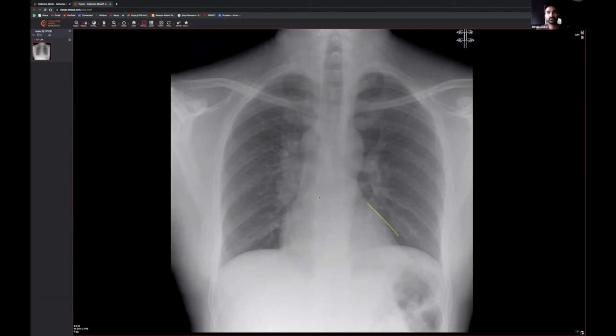And then look behind the heart. We don't see any abnormalities, no lesion behind the heart. We don't see any sail sign. Sometimes you get tenting of the diaphragm to tell you that there's been some loss of lung volume within that hemithorax, which we don't see. Sometimes you get elevation of the hila, but the patient's slightly rotated, so there's not quite equidistance between the two, maybe slightly angled when they took the X-ray, but it doesn't look like there's any particular loss of lung volume. The distance between the ribs looks okay as well. That's another way to tell whether there's any loss of lung volume.